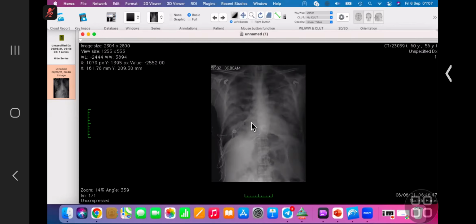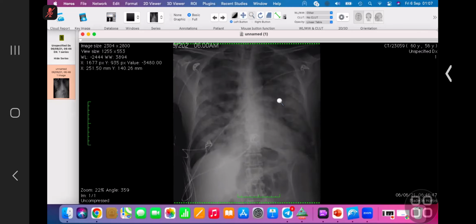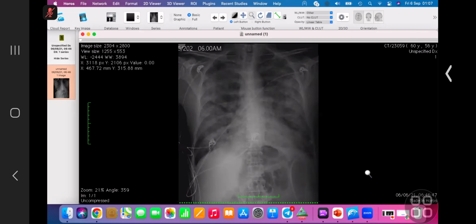On my first inspection, there is a bilateral peripheral fluffy hyperopacification of both lung fields, mainly at the mid and lower zones, however sparing the CP angle and the most superior aspect or lung apices. This gives the reverse batwing appearance, or the negative pulmonary edema. So I'm thinking about hypersensitivity pneumonitis. I'm checking the rest of the scan.